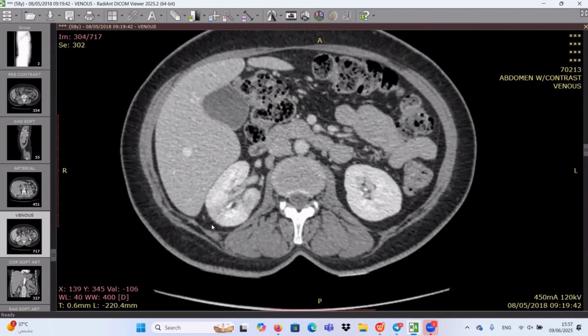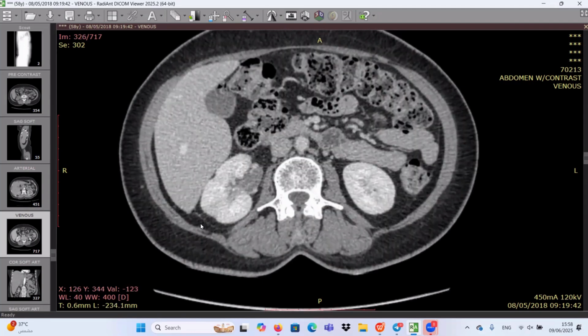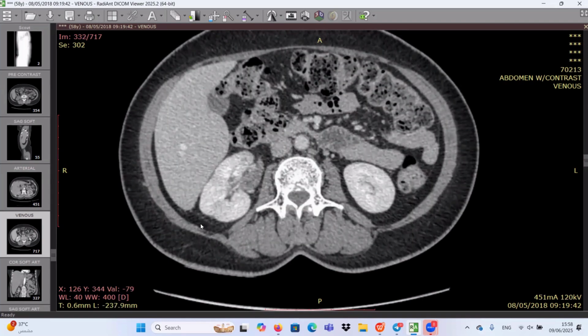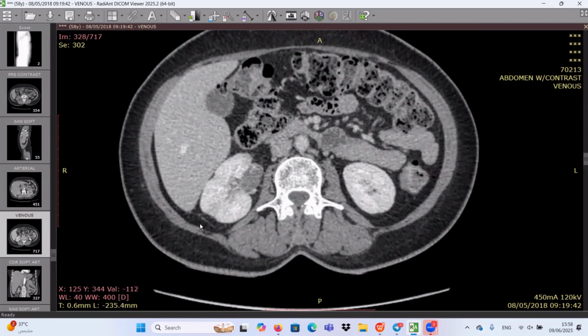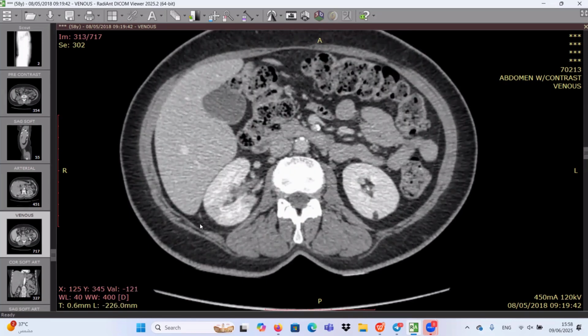I think it's the most logic thinking, as you said in your differential diagnosis, renal infarcts with multiple wedge shape hypoperfused areas with filling defects inside the renal pelvis proved to be blood clot, and this one was proved to be multiple renal infarcts with blood clot. And the blood clot, by the way, is a common association with renal infarcts.